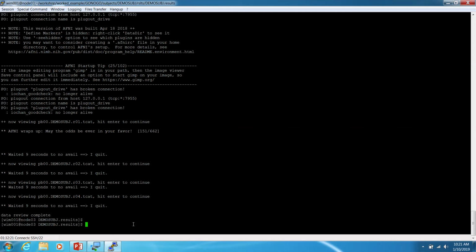So then at the end of the review, what we would have seen was something very similar to that last little jump between runs. And if you get a subject that's moving a lot, the image does a whole little jig the whole time. And that's really bad. You don't want a lot of short movement. Things get accounted for much better if you have a movement and it's either abrupt and you move back, or there's a shift and things are pretty static. That helps things work better in the overall results.